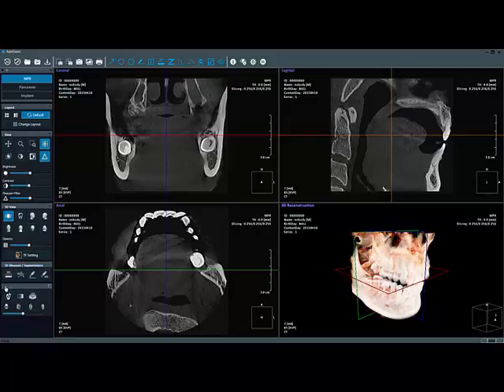Now let's take a look at the main toolbar. The main toolbar contains tools which can be accessed to perform certain functions on patient's images. You can reset, open, and save files, easily capture the area of interest, and print. This blue area allows you to do free draws, such as arrow, circle, polygon.